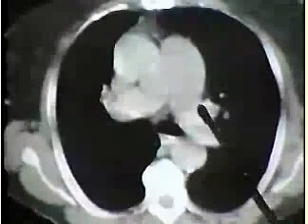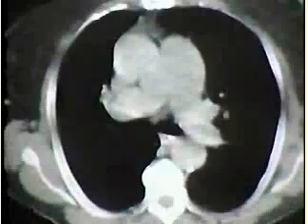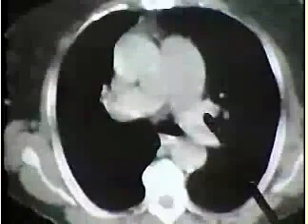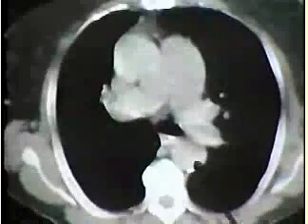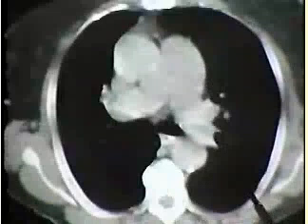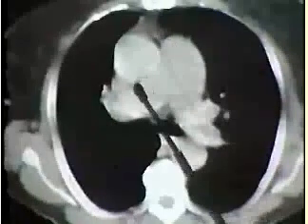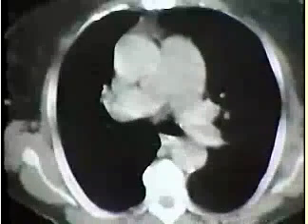Large left vein. We go down a little bit further. We see, actually we're going up a little bit further to see the left pulmonary artery, large left vein, which makes a vascular shadow within the curve of the artery, as we saw on one of the earlier diagrams. We even have a kink in the right pulmonary artery here to make it look confusing.